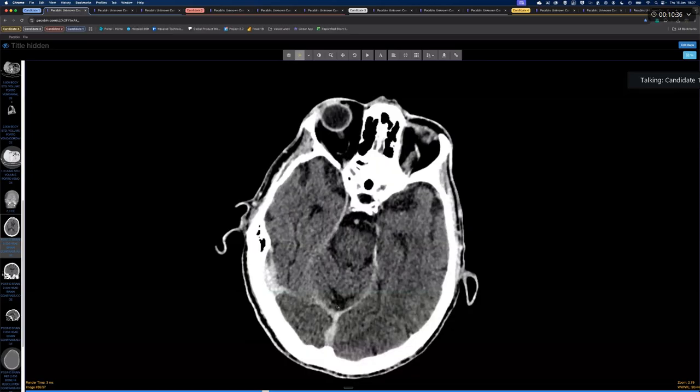Okay, so small ring enhancing lesions, 2 of them on the right cerebral hemisphere. This carries the possibility of an infectious process like neurocysticercosis. Other possibilities could be brain masses, metastasis, or it could be infarctions, yes, acute infarction.